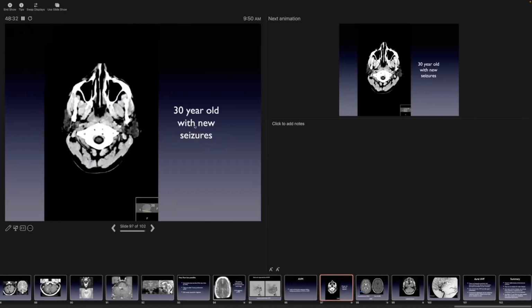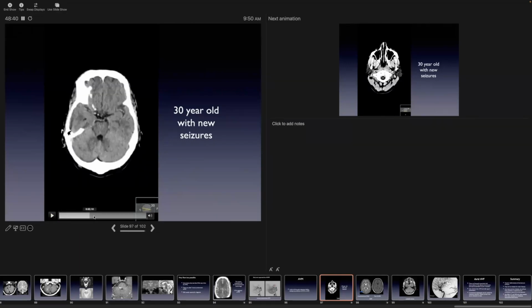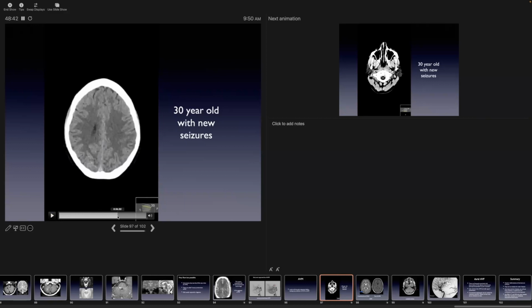And so before you make the diagnosis of an arteriovenous malformation, look at all the pulse sequences. Let's see if I can get this to run. Here, I just want to show you this case. Here you see this lesion here in the parieto-occipital region with some high attenuation.